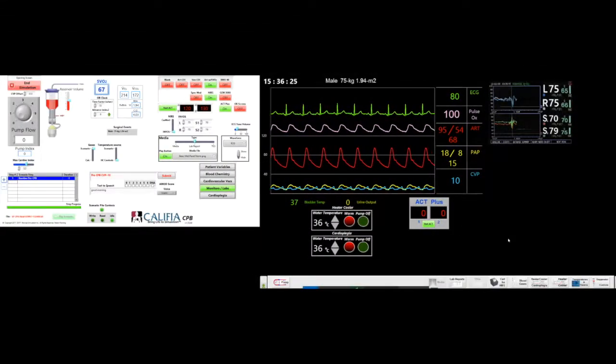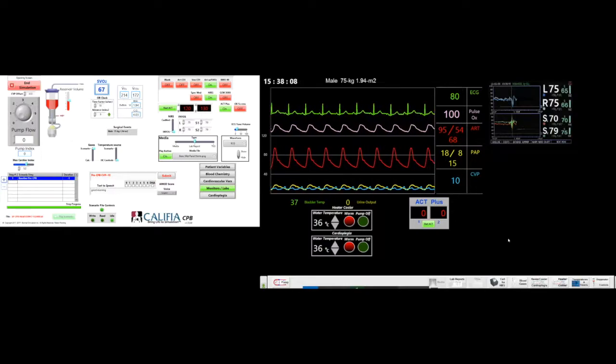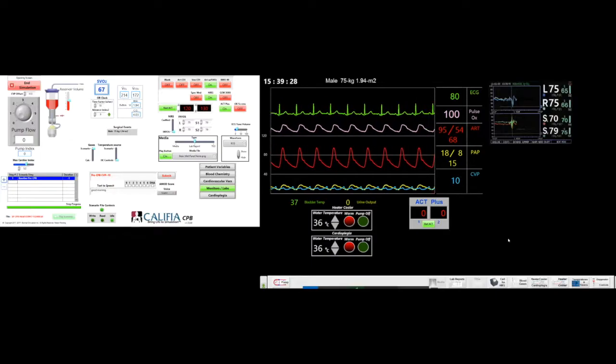So this is part 3 of our series of training videos on routine cardiopulmonary bypass on the fly. We're at a point now where we've gone over all the things in most of the categories in the instructor screen, and the other parameters are on the learner screen. And we're coming to the point now where we want to go on bypass.